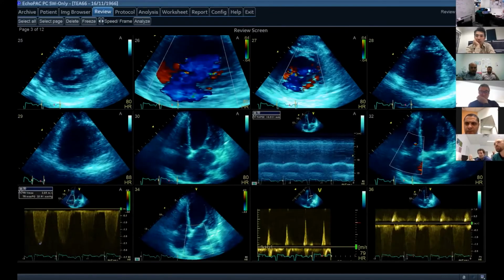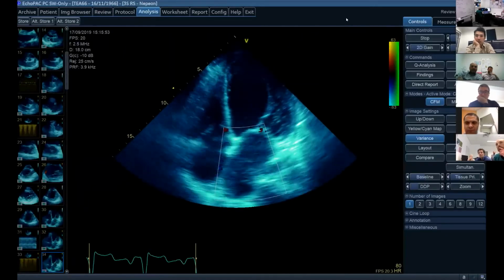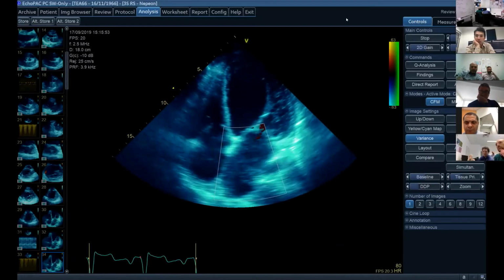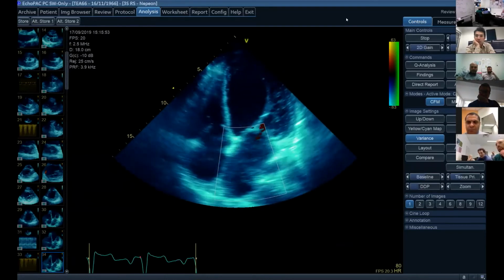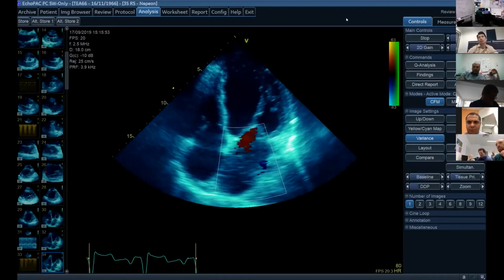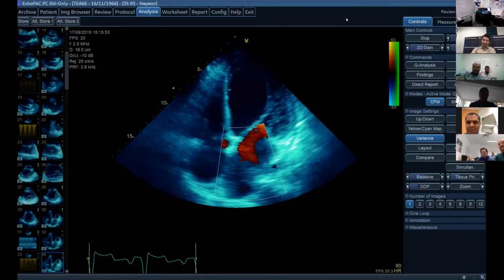Sid, why is it challenging? Why do you find it difficult to estimate the severity on that? Just because it's an eccentric jet. Fantastic. And why? So take me through. In the exam, if you just leave it saying it's difficult to examine, the examiner is going to ask you why it's tricky to estimate the severity of mitral regurgitation with color Doppler on an eccentrically directed jet.